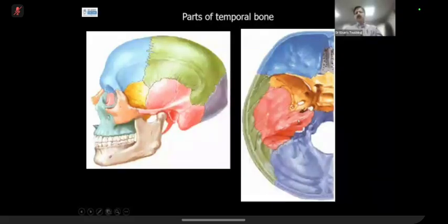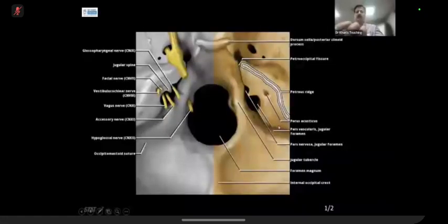Now, this thing here, if you see, is known as the arcuate eminence. This is a thick part which makes the superior-most portion. It is superior to the superior semicircular canal. So these were the features; let's take it further.